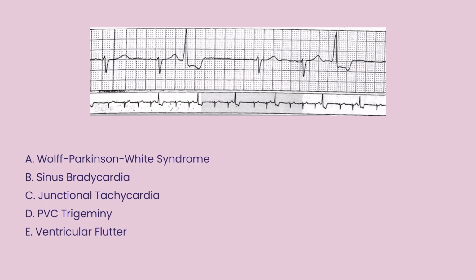Alrighty, same sort of thing. What stands out are these guys here, okay? And so we're looking for premature ventricular contraction. And when we look at our answer choices, that leads us to PVC trigeminy.